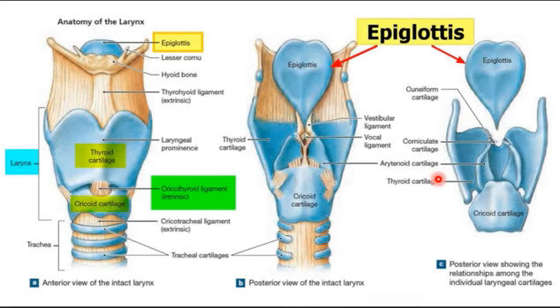Now we come to the aerodigestive entity. We finished the cutaneous and subcutaneous entities, and now we come to the aerodigestive. We start from the epiglottis, and then we come to the larynx and the visualized parts of the esophagus and the trachea. This is the general anatomy which we know from previous times of the larynx and the epiglottis.